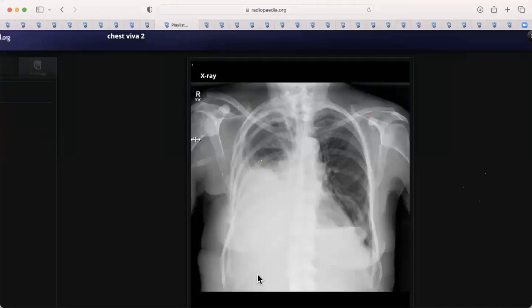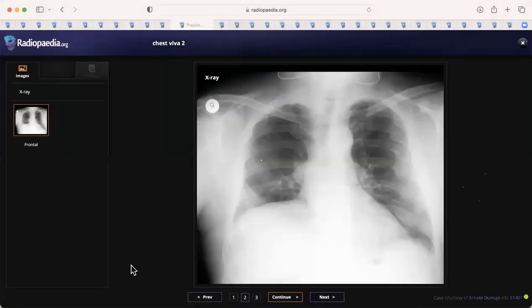This is a malignant pleural effusion in a patient with breast cancer who had a previous mastectomy. So that's just a simple pleural effusion, and here the meniscus sign is the giveaway. There are other clues that gave the diagnosis of malignant pleural effusion. This was just an elevated right hemidiaphragm, and these kinds of cases are in the exam for discussion purposes. There is nothing, it's just an elevated hemidiaphragm. So the examiner wants to know how you're thinking about it. We said there are some lung causes, there are diaphragm causes, and there are abdominal causes.